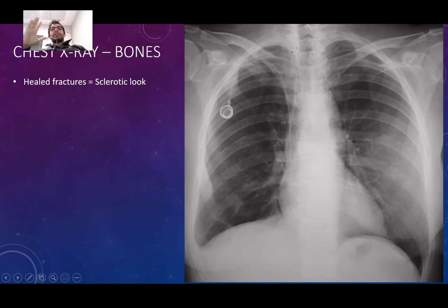I'm seeing some other things in this lung X-ray. If you have a systematic look, we will see a lot of things in this image. Let me show them one by one. I'm actually seeing some prosthesis on the left breast, right? So the patient actually has a left mastectomy. Also, I'm seeing a port catheter here. So the patient is probably still receiving chemotherapeutics.